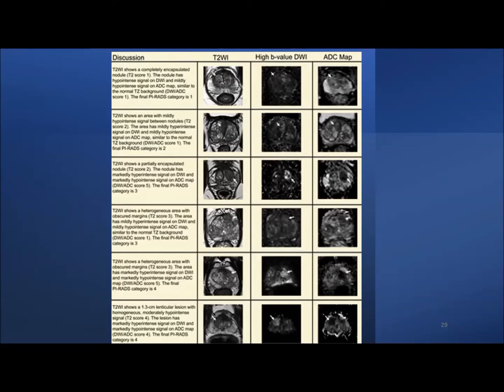That black appearance you have to match with the appearance of the lesion to characterize that lesion as markedly hypointense. If it is matching, then you just label it as markedly hypointense. And again, the criteria for category 4 and 5 is the size: if it is less than 15 millimeter, then 4. If it is greater than or equal to 15, then it is category 5.